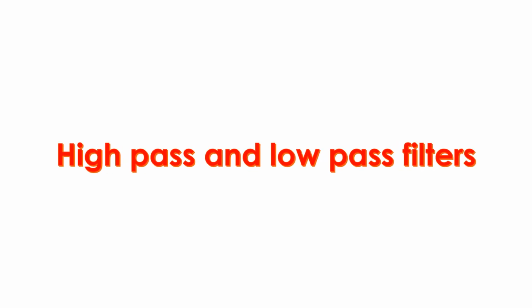What are these high pass and low pass filters? Here the high pass filter is at 0.5 Hz. It means that only signals above this frequency level will be detected. This filter is meant to filter out the baseline fluctuations due to respiratory thoracic movements, which are in the low frequency range. The low pass filter is meant to filter out high frequency signals, mostly electromyographic in origin.